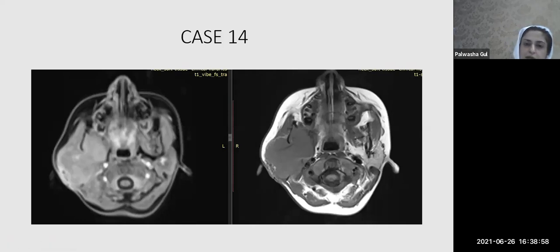She's a 5 to 6 year old patient, and if you feel this is malignant, which it seems to be, infiltrating the adjacent muscles, then the key to activating your thought process is also to think about the demographics. If this is a pediatric age group and I'm dealing with a head and neck tumor, one of the things that should come into my mind is rhabdomyosarcoma, because we know it's very common in the head and neck region of the pediatric age group.